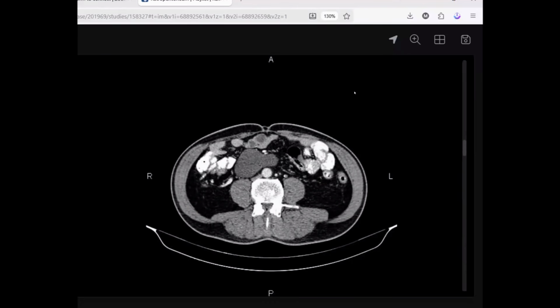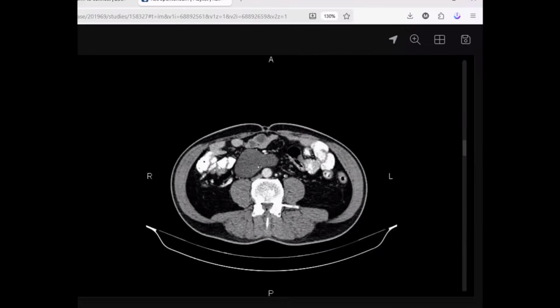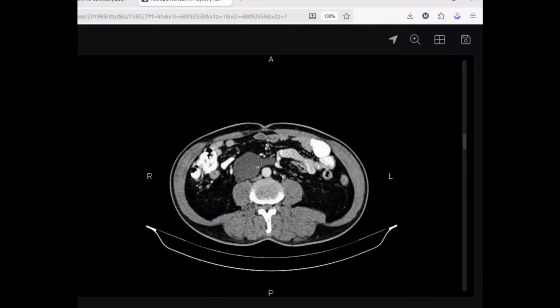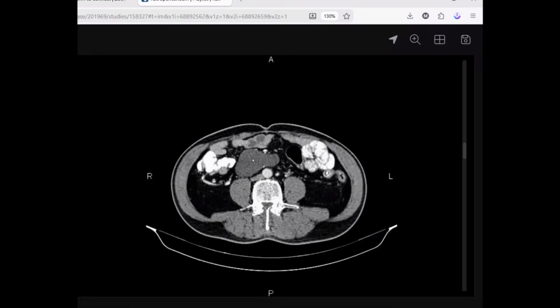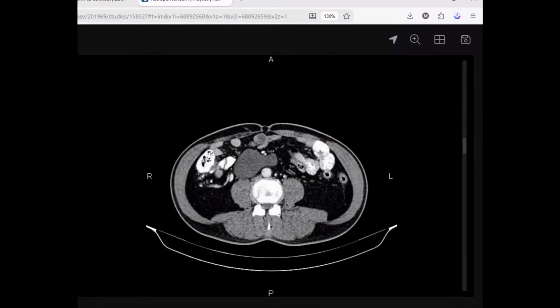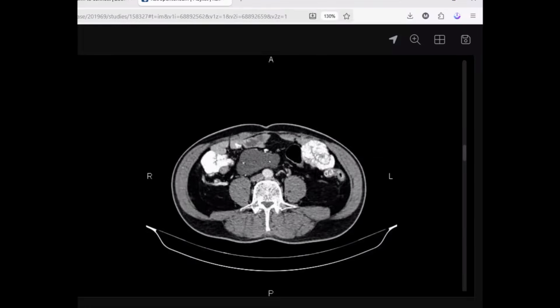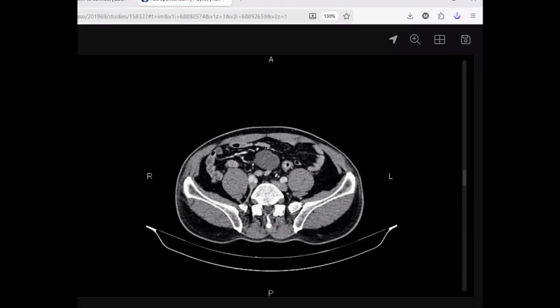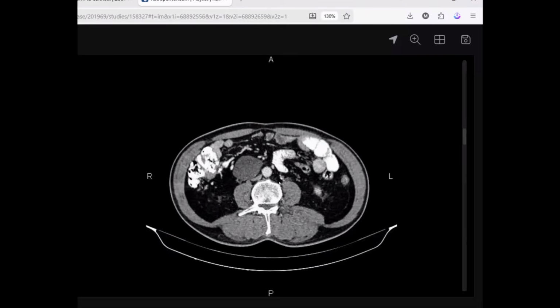It's cystic, lobulated, fluid density. We may have some flakes of calcifications in between. And if we have something like this, we should compare with the previous scan to check if it is stationary or not. And this one is considered a lymphatic malformation, one of the most important retroperitoneal structures. It's characterized by cystic fluid content, sometimes flakes of calcifications. And as you said, it's not aggressive. It's causing a mass effect as you described.